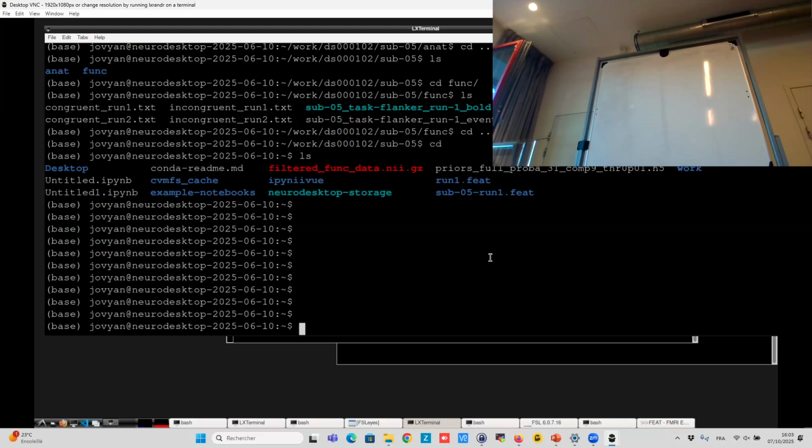I'm saying that because I saw someone do that. So don't worry, take the last one. So now you need to locate where it is. Does everyone have this folder located?